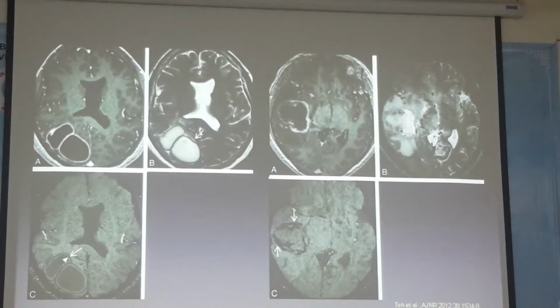And then if we go to susceptibility weighted imaging, now we see that there is a definite difference between these two. There is a rim of abnormal signal. This is not enhancement, but there is a rim of bright signal and then another rim of dark signal around it, a double ring kind of sign that you see with the abscess only. Whereas with the glioblastoma, we see this irregular dark rim, but we do not see that bright rim as well, where the arrows are.